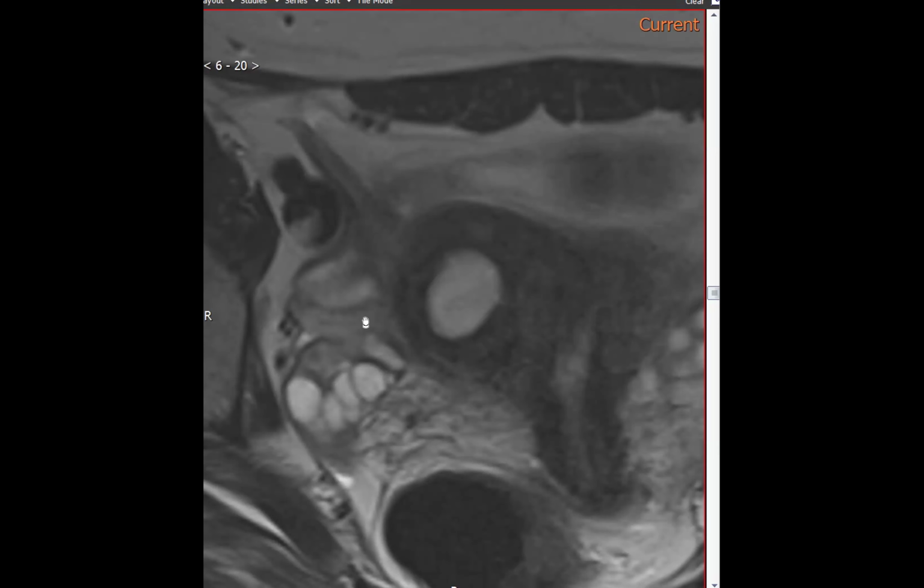What I use as a hint is T1 bright and this round ligament attachment. One of the cases that I presented, they resected it and it came back as a cystic adenoma. And it wasn't a small one. So it wasn't 5 millimeters. Correct, yeah.